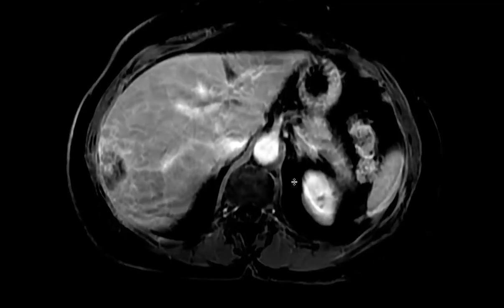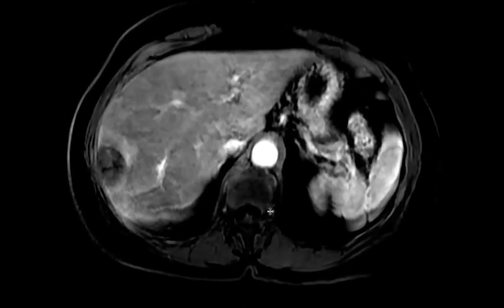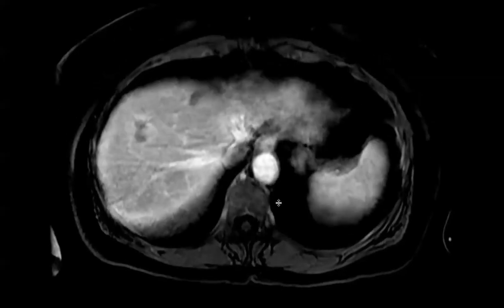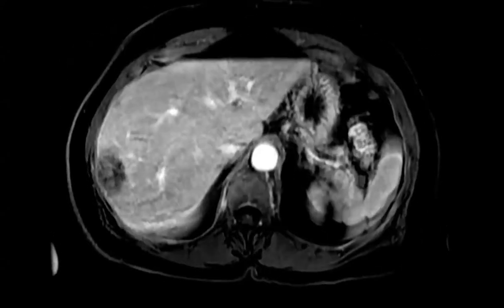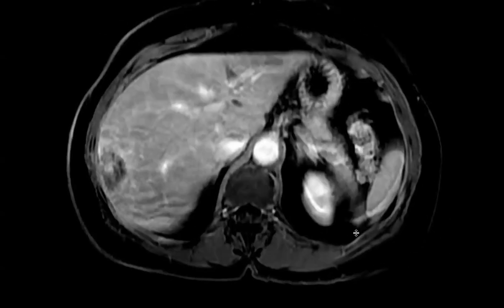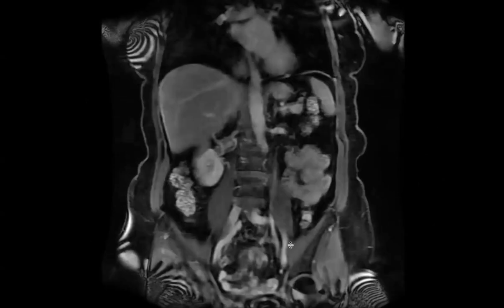I think it looks like it. Let me get an arterial phase, maybe that'll be better. I'm not sure if it's the artery or vein they allude to, but they say there's a vessel feeding that lesion, which represents the stalk of the lollipop, and the lesion itself, the rounded part, is the candy. Well, I'm going to hallucinate that this is the lollipop stick. Maybe. Anyway.